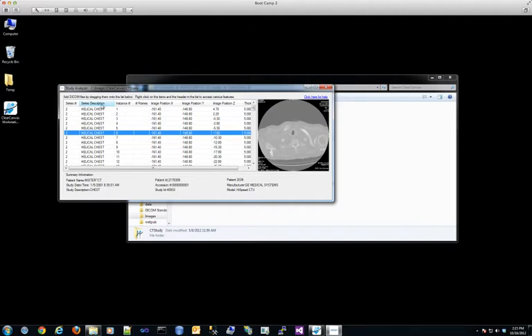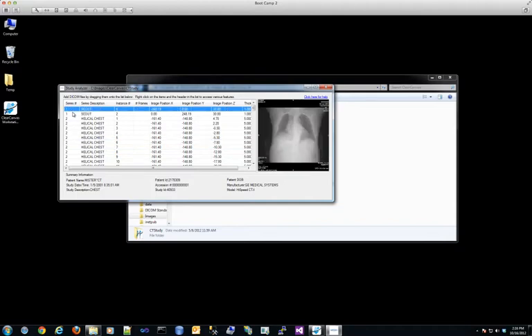dynamically on the fly. What I mean by that is I open a study that has two series, a Scout series and an Axial series. If, for example, I didn't really care about the Scouts and I was going to do some analysis or exploration related to just the Axials, what I can very easily do here is choose the two Scout DICOM files and hit the delete key on my keyboard, or right-click and choose remove instances from list, and it'll remove them from the grid control.